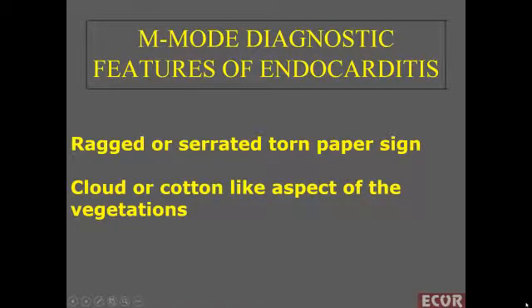I'm going to add an issue not usually reported in the lectures about infective endocarditis: the utility of M-mode for the diagnosis of vegetations. We had talked about the usual features of a vegetation: the site of the vegetation, the associated regurgitation, the chaotic movement, no restriction of valve movement, and the always necessary clinical suspicion for this diagnosis.